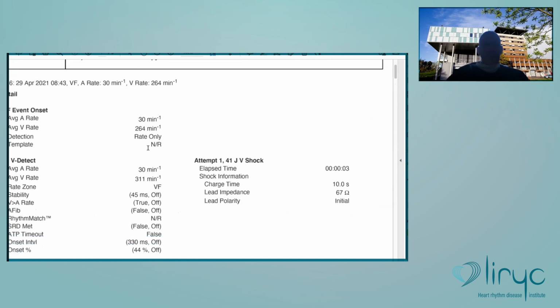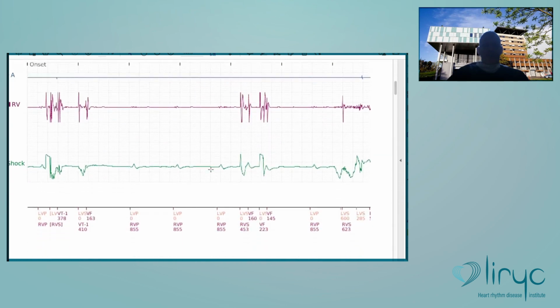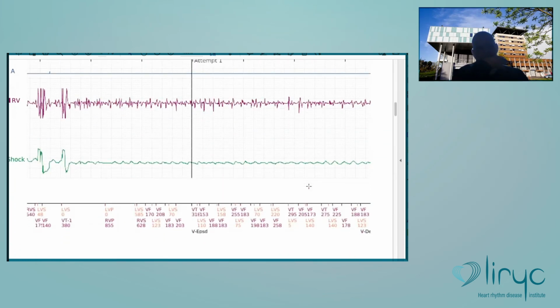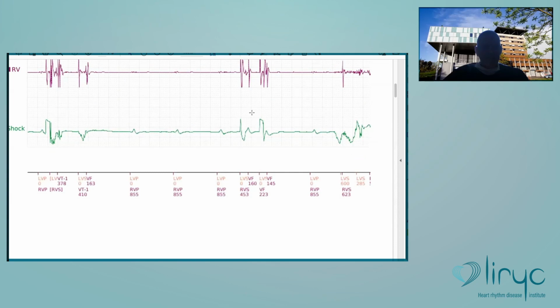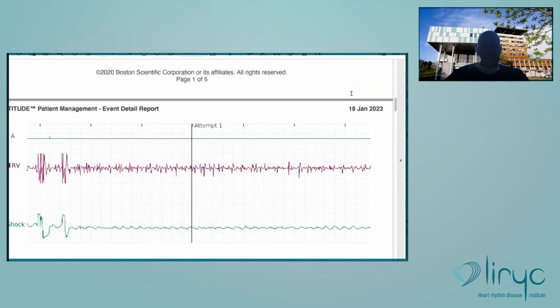In the same center, now you see a shock is delivered. What do you think here? Well, again, it's oversensing. Yes, still the same kind of oversensing. And then this looks more like VF after. Here the patient is paced. Probably electrical scalpel, also at the time of surgery. Very fast signals and inhibition of pacing, quite long cycle. And then the onset of something here. What do you think?